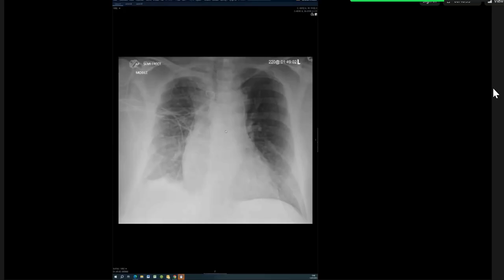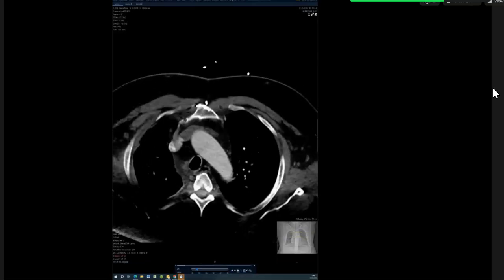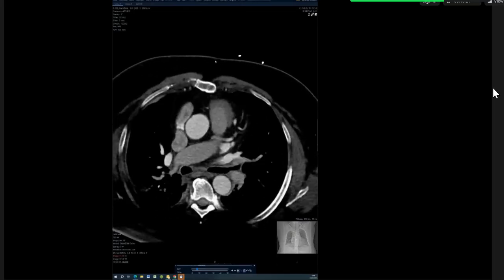I think it's one trick sometimes we use just to make sure we don't miss a life-threatening abnormality, but saying it doesn't seem as smart as we want ourselves to sound. So this one is a heart failure patient with a sternotomy. But this patient has an abnormal echo, and is deteriorating quite quickly. He has had previous heart surgery for an aortic valve replacement. Let's see if you can spot the abnormality.